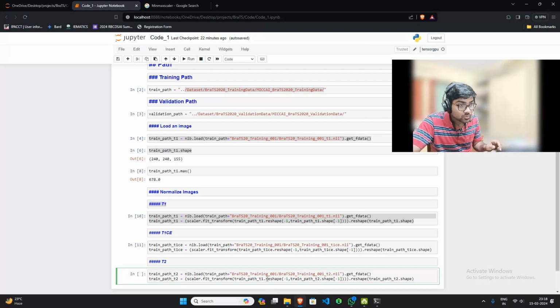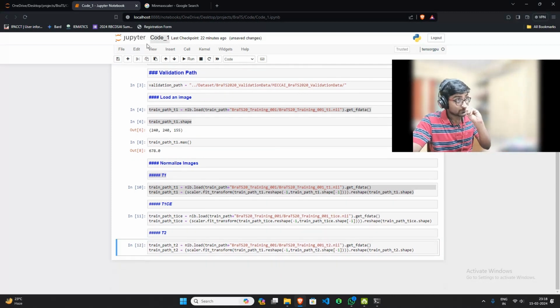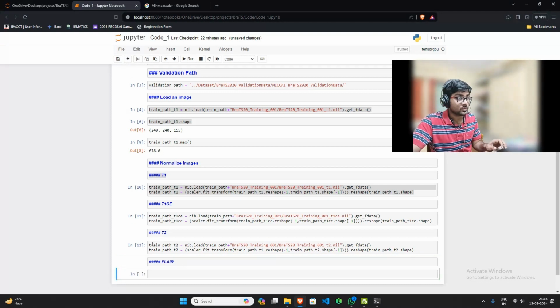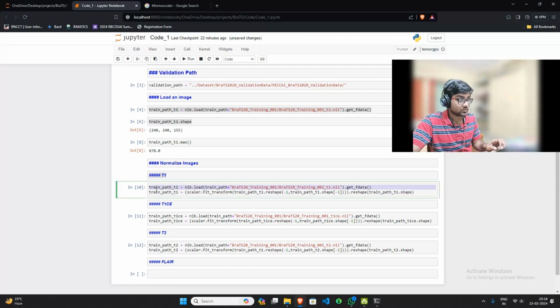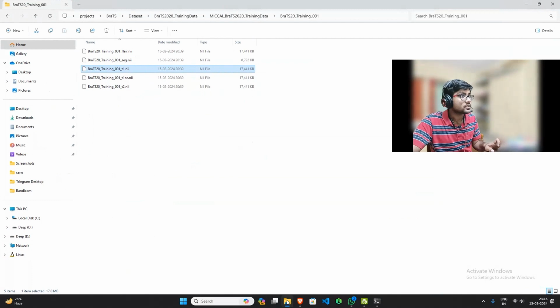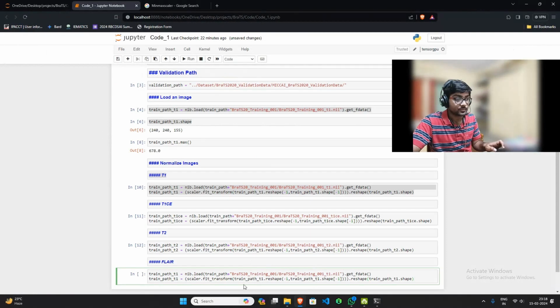I think this should work. Okay. Next what we'll do, we're going to put FLAIR. I think FLAIR is left. 3.5 FLAIR. The name once again. Yeah.